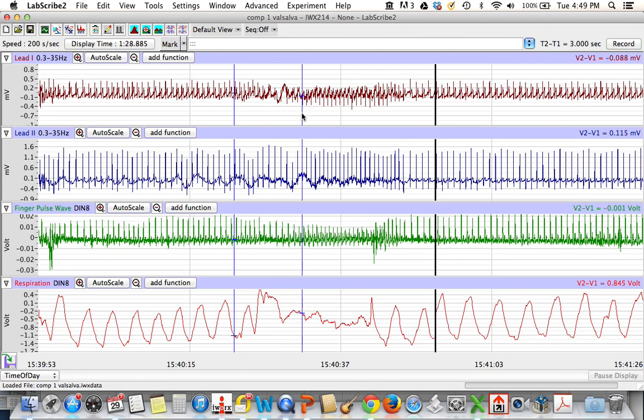So let's see what we have here. So this is where it ends, probably here. And so that's 220 seconds, so then we want it to be at 229. So I'll keep going out. Get close here. That's good. All right, so that's our window.